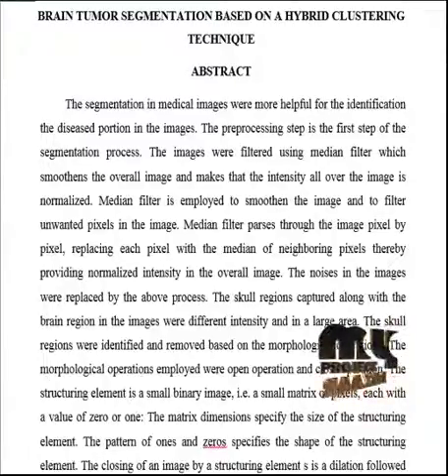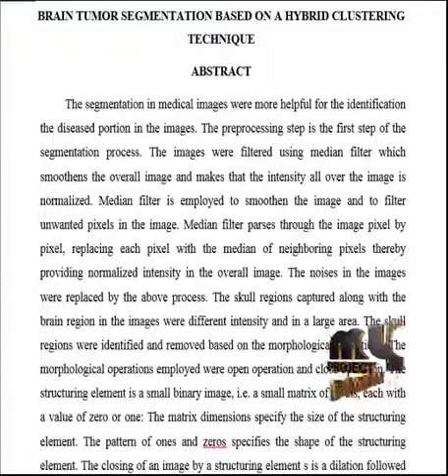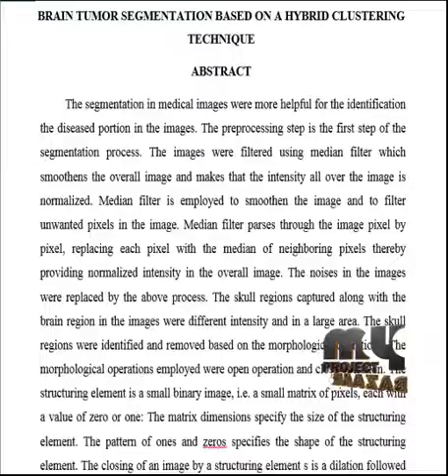The image pixels that were greater than the threshold value were assigned the label 1 and the others were given value 0. The pixels that had value 1 are the tumor portion in the input images and the others were the normal image portions.